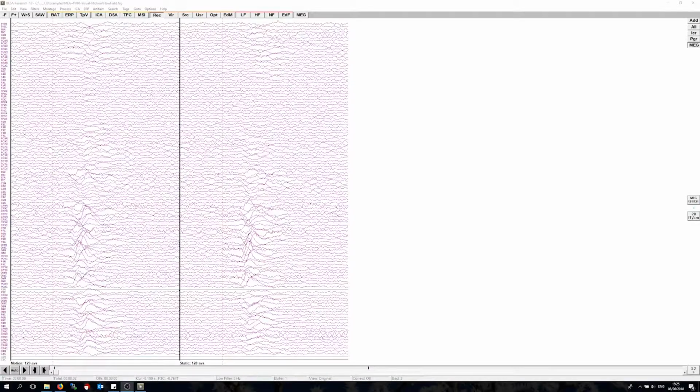This video will demonstrate the use of brain atlases in BESA Research. We will have a look at brain activity evoked by a visual motion field in an MEG experiment. We have the average data available here and have co-registered the dataset with an individual structural MRI of the subject.